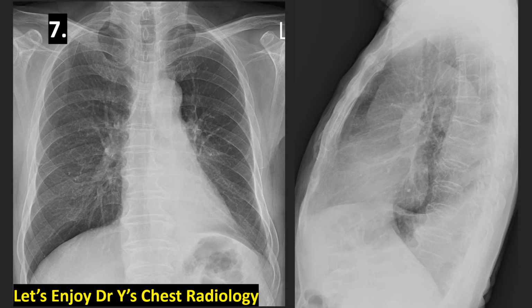The last case, and also an interesting case, what do we see? This old man. Yes, at first glance, it's looking somewhat normal, but we can find something wrong about the left heart area. We see no aorta, no paraspinal stripe on the left side, and the left diaphragm is also not clear on the medial end, and we don't see the normal vascular structure and airway behind the left heart, left ventricle.